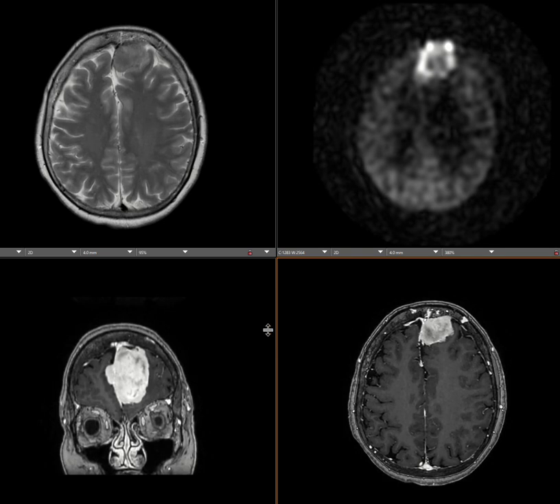Today we are going to talk about an interesting entity which is a very basic and important concept in neuroradiology. When you see a mass, you just need to discuss if the mass is intra-axial or extra-axial. So basically, is it arising from the structures outside the brain parenchyma, like the dura or bone or other outside structures, or is it actually arising from the brain parenchyma itself?